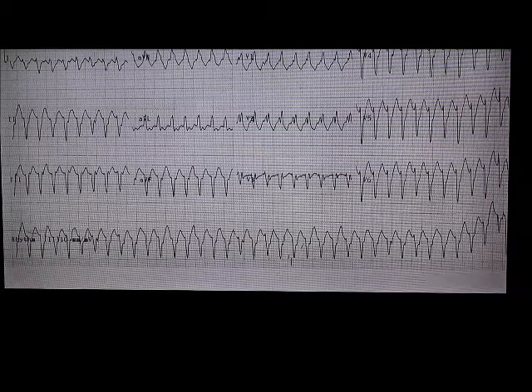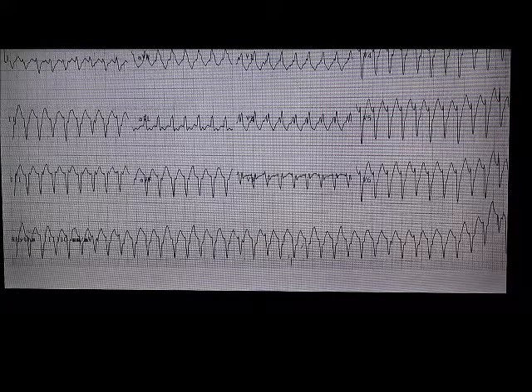Okay, this one. AVR positive. Okay, continue, but talk about the other criteria too. AVR positive, right. There's a paper about the AVR algorithm, and they just look at AVR, and it's helpful. But just for practice, continue. Wide complex tachycardia, with a right bundle branch block pattern.